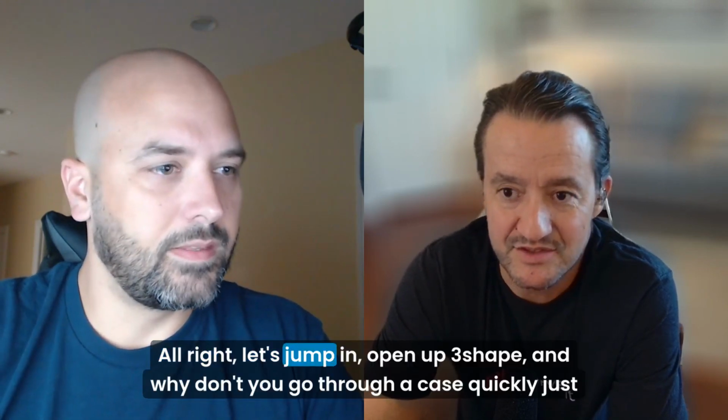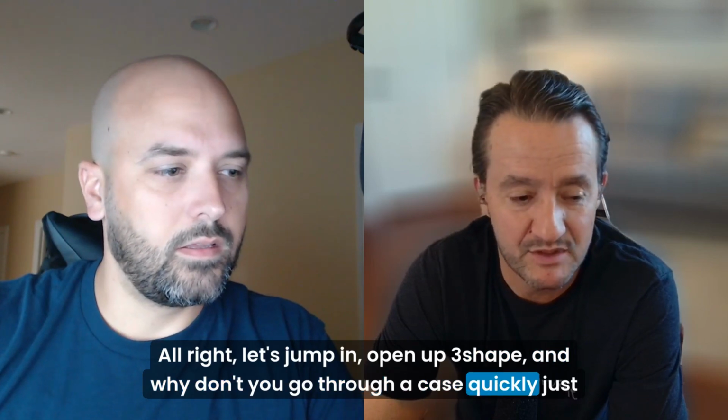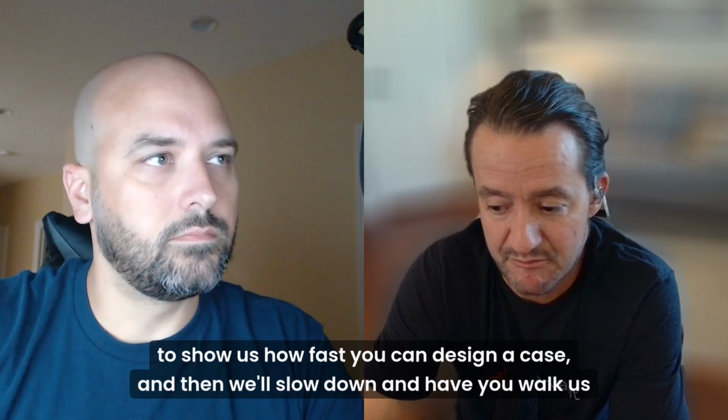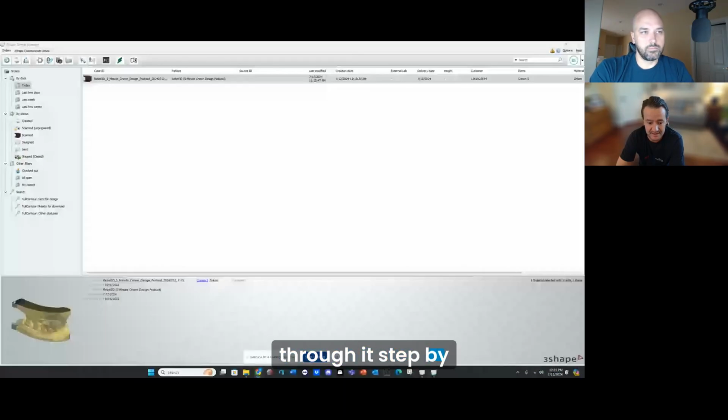All right, let's jump in, open up 3Shape, and why don't you go through a case quickly just to show us how fast you can design a case, and then we'll slow down and have you walk us through it step by step. Yeah, definitely.